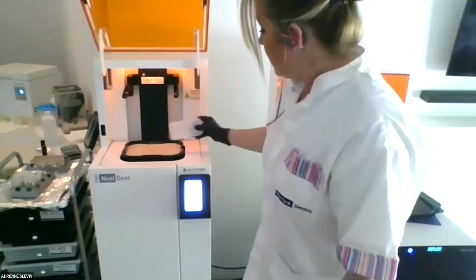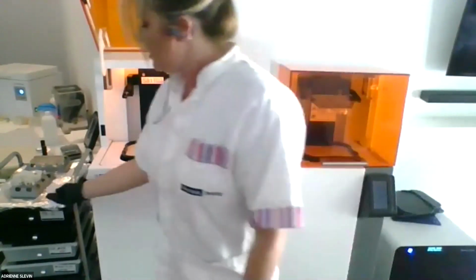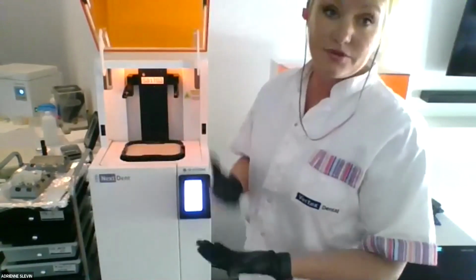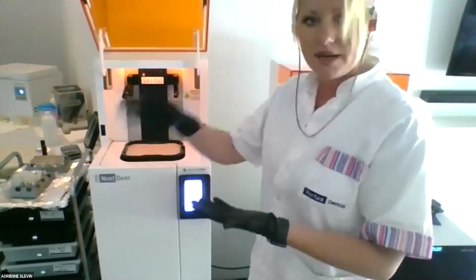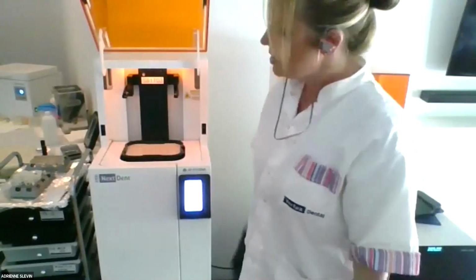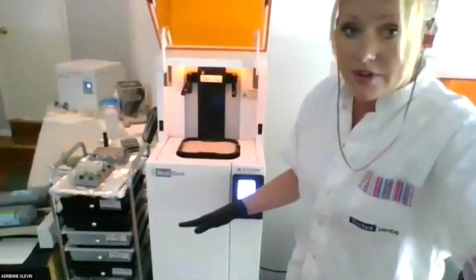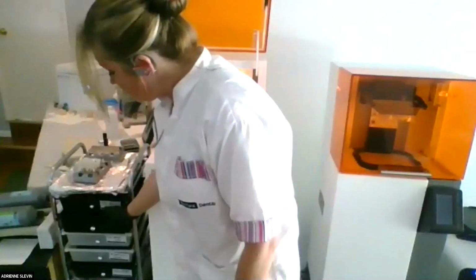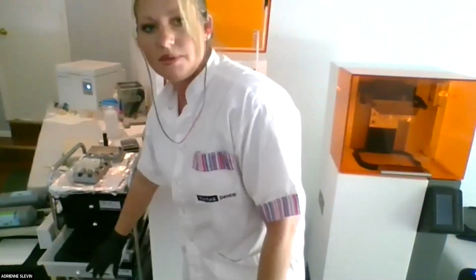Now, if you do use Crown & Bridge MFH in any other printer or this printer, you'll want to make sure that you stir it every single day or every 2 days, because it does settle, like I said, and you don't want to have to spend time stirring for 20 minutes. It's much faster to stir every day. So I keep my trays in an easy to access area. You can see here that I have a little drawer for everything. I have them labeled, so I can open them up, stir them, and then close them back up.